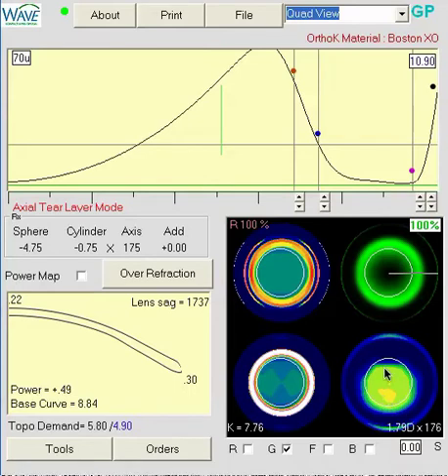It's concentrated more inferiorly, and in the topography screenshots, that was also reflected there. That said, if we look at the corneal cyl, the patient has about a diopter and 3/4 with the rule, but in the refraction, there's only 3/4. So this patient has a fair amount of internal cylinder, and it's actually desirable to have some corneal cylinder residual to kind of negate the internal cylinder. If we sphericalize the cornea completely, then this patient would probably have a refraction of something -1, axis 90 or so, and that is not going to be an ideal visual outcome.